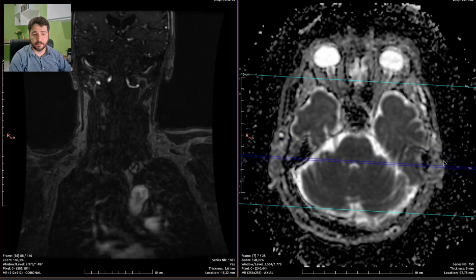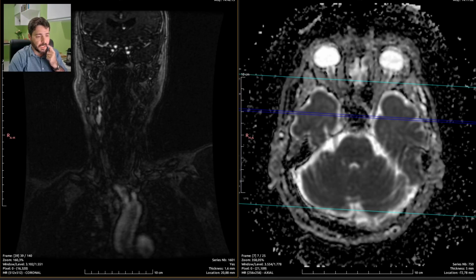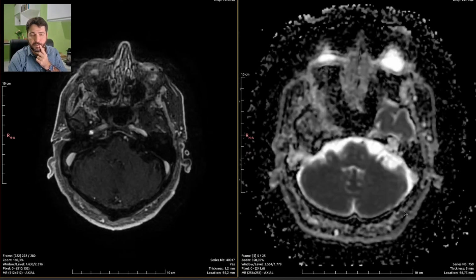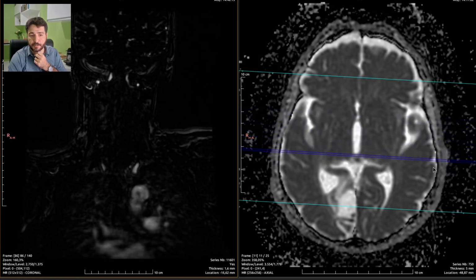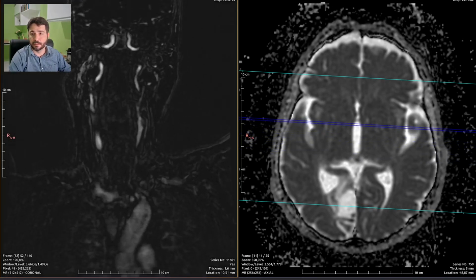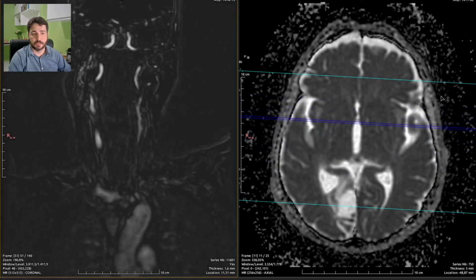It's contrast enhanced, of course, because contrast enhancement makes a complete difference no matter how great is the scanner. Contrast enhancement for arterial MRI angiograms is always the best choice, because the neck is a brutal place to scan. So let's go for the coronal view, because this is the original view.